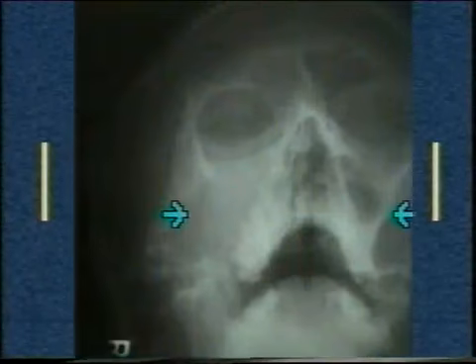This X-ray shows a uniform haziness of the right maxilla. Now compare it with the normal side and pay attention to the lateral wall of the maxillary sinus. On the right side, the lateral wall is missing. Destruction of the bony walls is a sign of malignancy. This is a case of CA maxilla. On comparison, destruction of the orbital floor can also be appreciated.